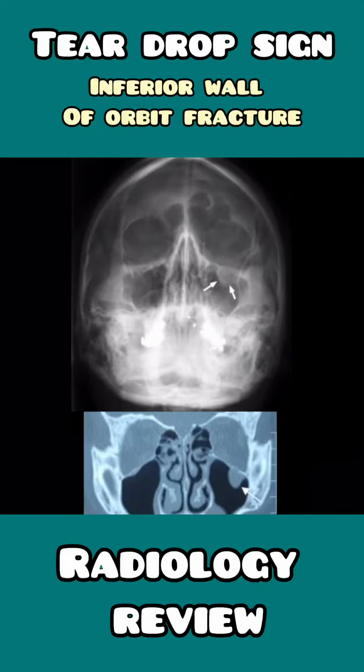With these radiological images, let us quickly review the inferior wall fracture of the orbit. Over here you can see that this is the inferior wall of the orbit, and the inferior wall has fractured, leading to herniation of the contents of the orbit into the maxillary sinus. This structure over here is the maxillary sinus on both sides.